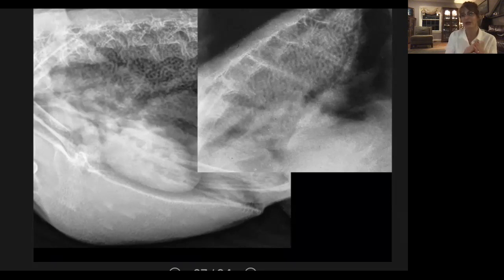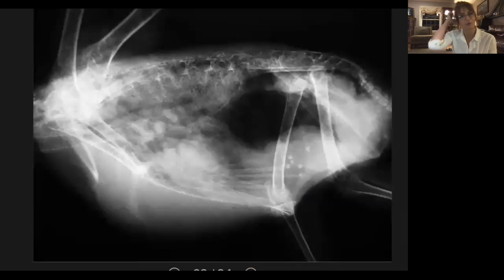So you have a diffuse and regular enhancement of that honeycomb pattern with edema, versus pneumonia, where you're just going to have either patchy, just complete collapse of those spaces because you have little granulomas in there, or beginning with inflammation, you'll just have enhancement of that honeycomb pattern, often in a branching or tree-like manner that I'll try to demonstrate here.